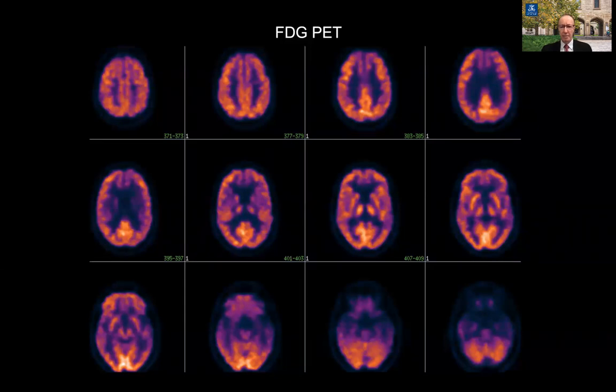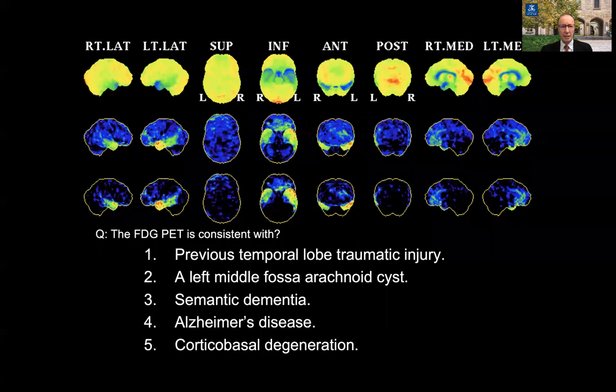Here's the FDG PET. I'll give you 20 seconds to look at this. I think we've got a Neurostat. Here's the Neurostat. And the questions.